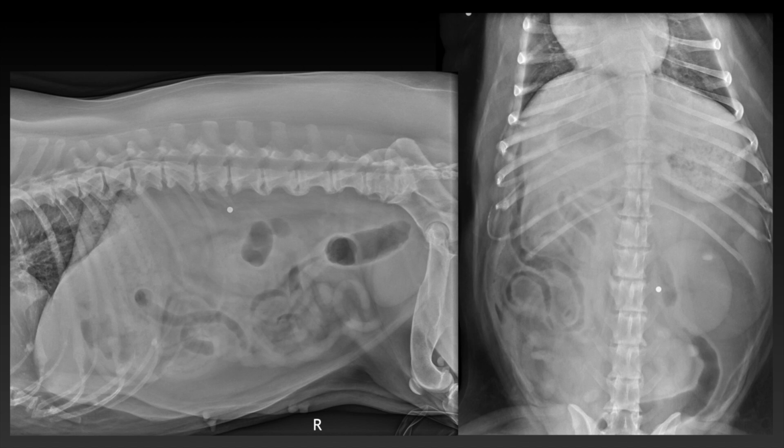We will start with the skeletal structures. There are incompletely bridging spondylosis present in the caudal thoracic, the lumbar spine, and at the lumbosacral transition. The lumbosacral intervertebral disc space is difficult to delineate, probably due to new bone formation and also rotation of the pelvis. So you see that the iliac wings are rotated against each other.